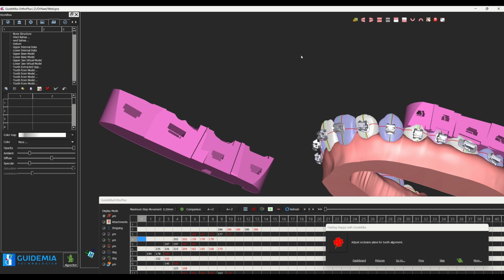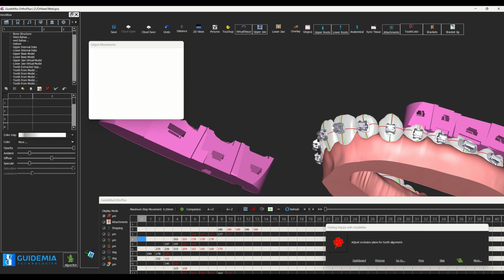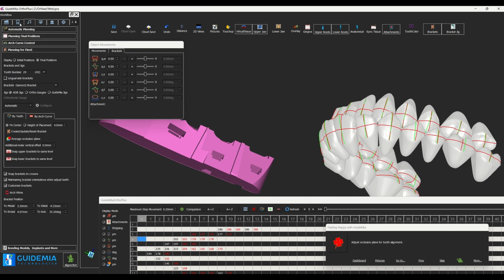In order to do this kind of guide, you actually need to have the jig. Alternatively, for some customers, we have developed a different design. For example, we use a traditional orthodontic gauge to create the jig here.